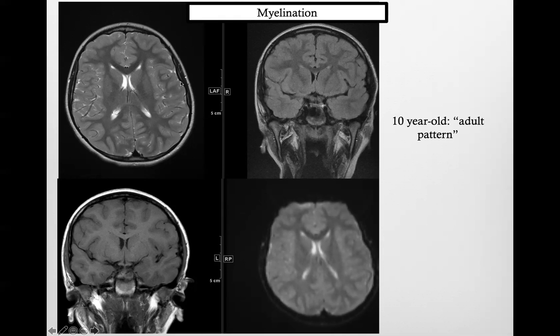And also you can see the spaces around the brain also full of fluid. In the T1 here, this is just another cut, it's a coronal, and we can do different sequences in different orientations. This is why MRI takes so long. In this coronal, you can see the opposite colors, let's say, so the opposite intensity in comparison to the T2. You have the dark signal in the liquor, the bright signal in the white matter, and a bit darker than the white matter, but brighter than the liquor, is the gray matter. So again, from the external part of the brain to the internal part of the brain, we have gray matter, white matter, and CSF or liquor.